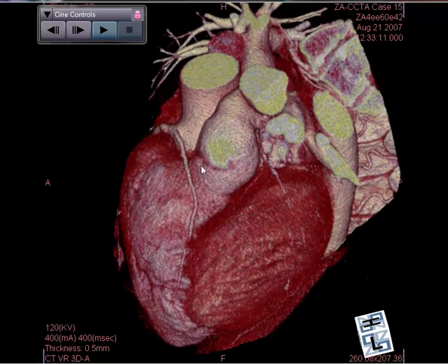Since this passes anterior to the pulmonary artery, this is considered to be an anatomically benign situation. This patient needs no further workup.